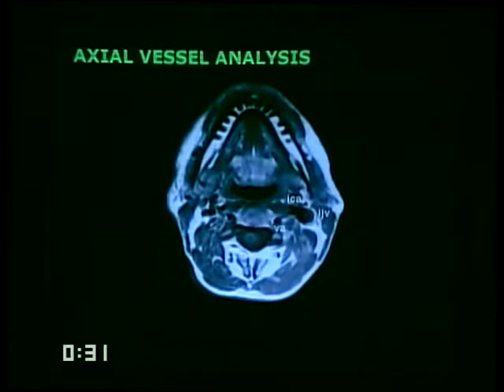Almost invariably, these artifacts are seen in the plane of imaging when you're just starting or ending your field of view. So discount any possible thrombus in the first few sections of imaging, because these are unsaturated spins entering the volume of acquisition.